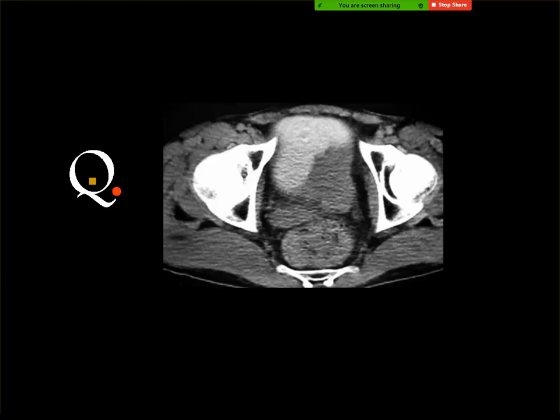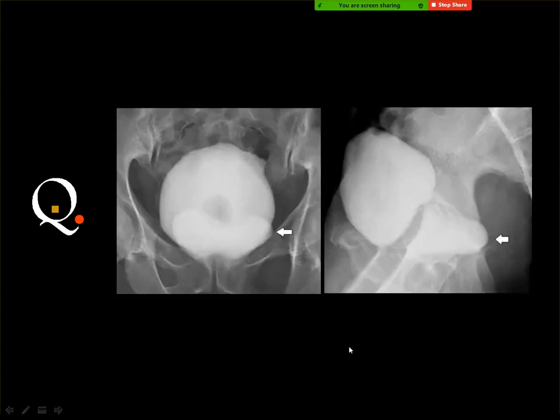Mass on the left aspect of the urinary bladder. Mass, yes, could this be transitional cell carcinoma? The mass or this one? The hypodense, sorry, hypodense lesion. This is urine in the urinary bladder, as this is with contrast. And you have a big filling defect, an area which is not filled by contrast, with a soft tissue mass in the bladder, diagnostic of transitional, yes, urothelial carcinoma.